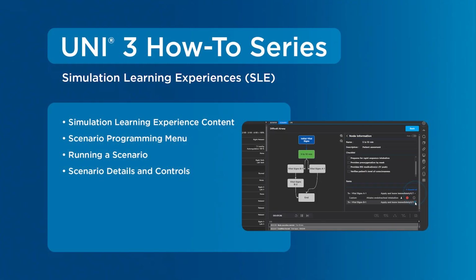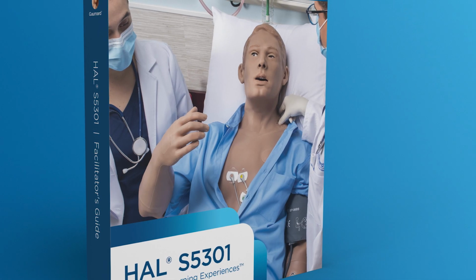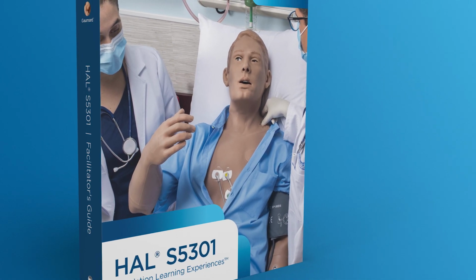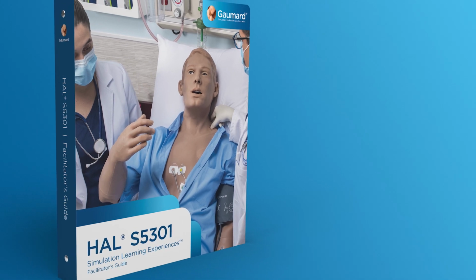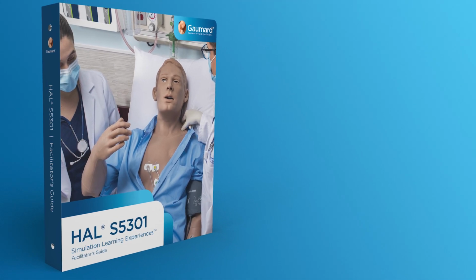This tutorial covers the UNI 3 programming included with the Simulation Learning Experiences packages. The SLE scenario packages provide you with a library of ready-to-use, evidence-based scenarios. This invaluable support content is designed to help you maximize training and learning.